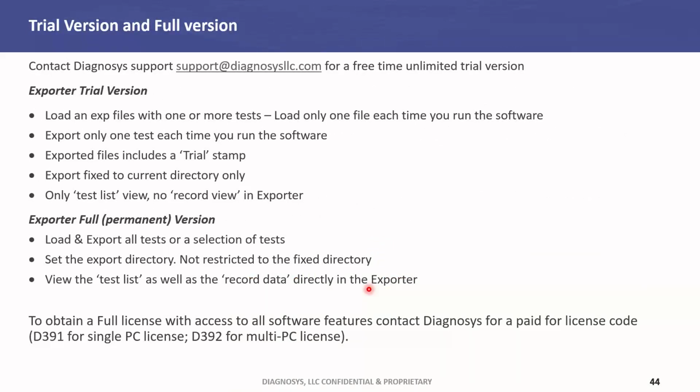We have free, time-unlimited trial versions available of this software for anyone who wants to use it. Just contact Diagnosys support. I'm very happy to give you a link to download this file so you can have a go at it and see if that will solve some of your bulk export problems and make your life easier.